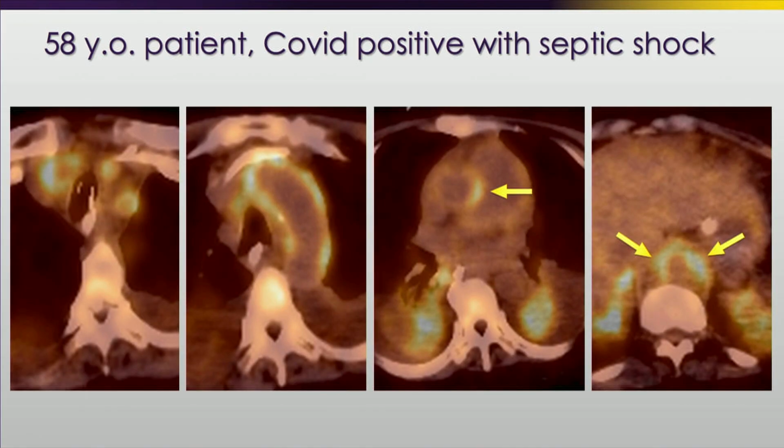And a correlative PET-CT imaging study shows us that there is indeed disease activity in these zones of aortic wall thickening in the takeoff of the great vessels, as well as an unsuspected zone of aortic wall inflammation at the level of the diaphragmatic crus.